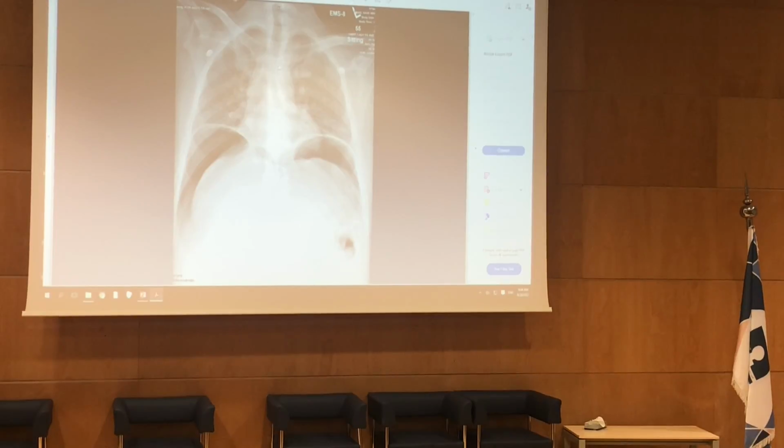So in the chest X-ray, we look at chest, mediastinum, lungs, bones, everything, and also we look at the upper abdomen, right? And we look below the diaphragm. So these are the diaphragmatic cupola, the left hemidiaphragm, the right hemidiaphragm. There is air, right? Black, there's no markings here, but it's below the diaphragm, it's not above. So it's pneumoperitoneum, right? And the stomach here is displaced. The stomach should be higher up, right under the heart. But it's displaced because of the air inside the abdomen.